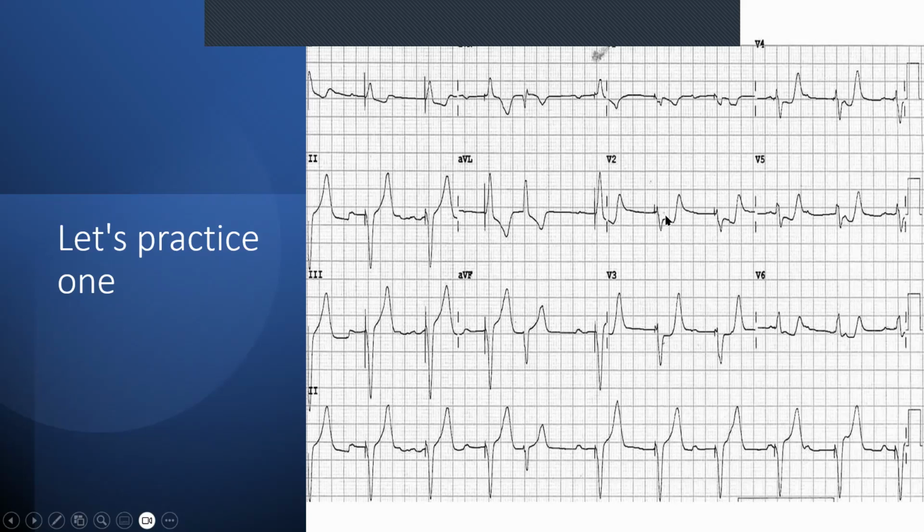So this tells us that we've got an anterolateral, let's say, because it's just starting to affect the lateral side as well. We've got an anterolateral myocardial infarction in the presence of a left bundle branch block. Now, you won't see reciprocal changes, for example. You won't necessarily see a lot of the classic signs that we've seen of myocardial infarctions, because this is what you need to look for: discordancy and concordancy. And you can see once you look at it, suddenly it's a whole lot easier.